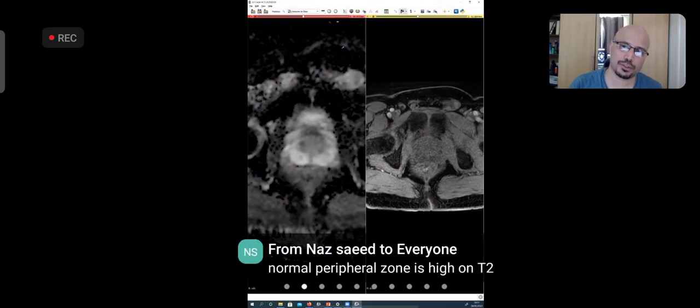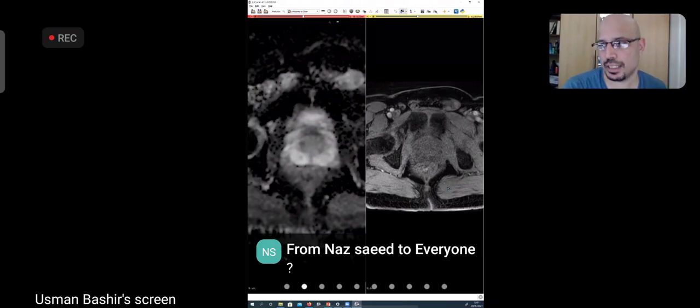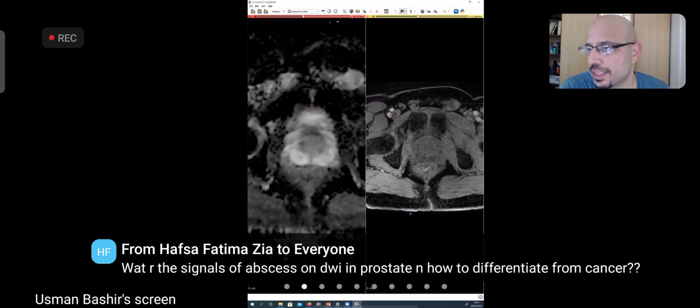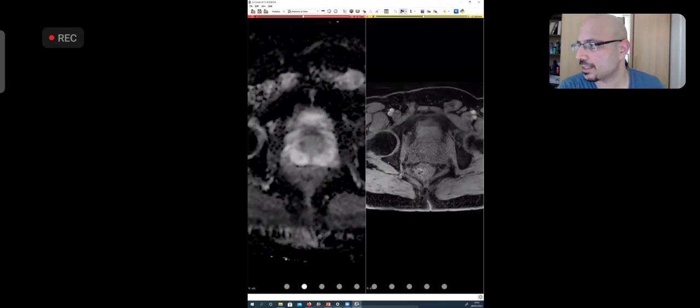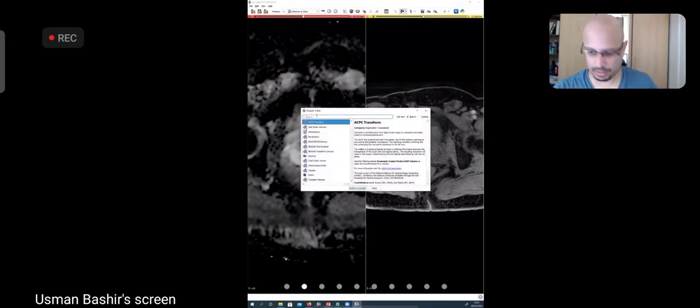That is also another thing. It's called temporal resolution. You should have a good temporal resolution, which means your scanner should be capable of acquiring series at a very short interval from each other. Right, so 13 to 18 seconds delay between series. You keep scrolling down, and your prostate begins to acquire contrast over time. You keep an eye on that area of interest and see if it blushes or not. So let's demonstrate it. There's an app which tries to do that, a multi-volume explorer.